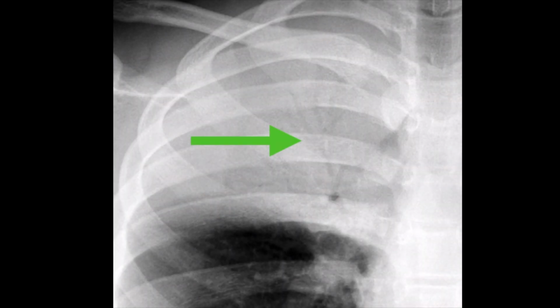This chest X-ray shows a dense consolidation with an intrinsic air bronchogram, the presence of which should exclude a central obstructing lesion. Nonetheless, consolidations in adults should be followed to complete resolution to exclude underlying malignancy. This just turned out to be right upper lobe pneumonia.